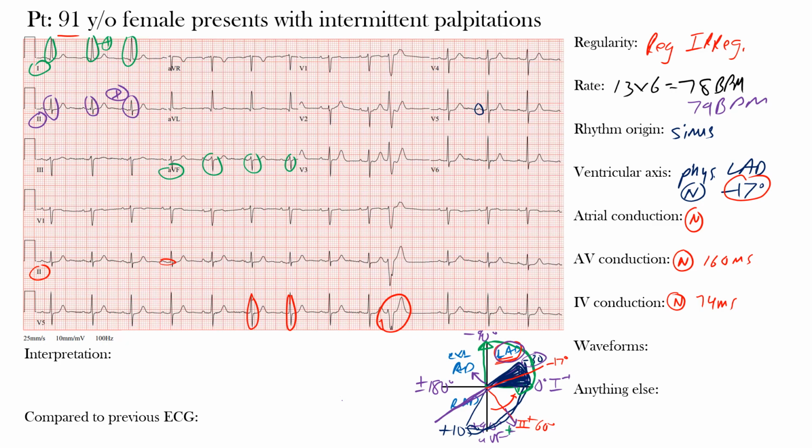Now, the T wave amplitude is typically greatest in leads V2 through V3, and on average is 0.3 to 0.4 millivolts in adult women. All right, now the PR segment, it's not significantly depressed or elevated anywhere. The PR and QRS intervals we said were within normal limits, and the QRS amplitude appears normal here. So no evidence of ventricular hypertrophy on the EKG. Now the ST segment does not appear to be significantly elevated or depressed anywhere.